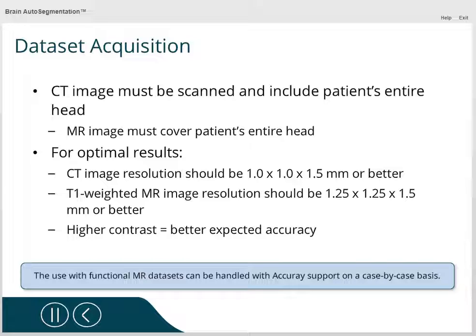For this reason, although it remains an option to override and use a deformable registration, this module will not address doing so. If chosen to proceed in this manner, the system will present the user with a warning that the deformable registration has been selected for use. For more details regarding deformable registration and/or selection of an alternative secondary dataset to run this application, you should return to the Fusion e-learning module.